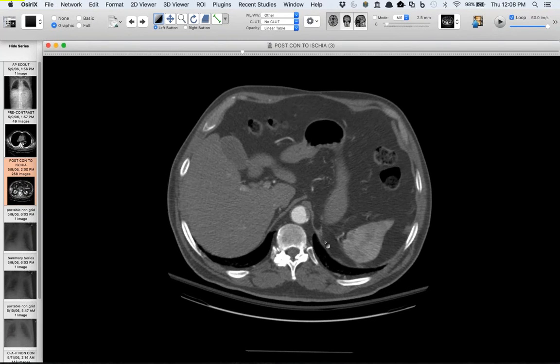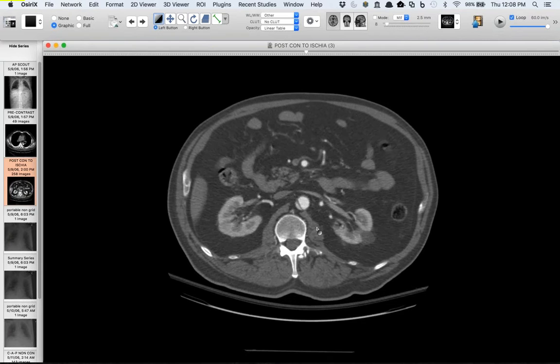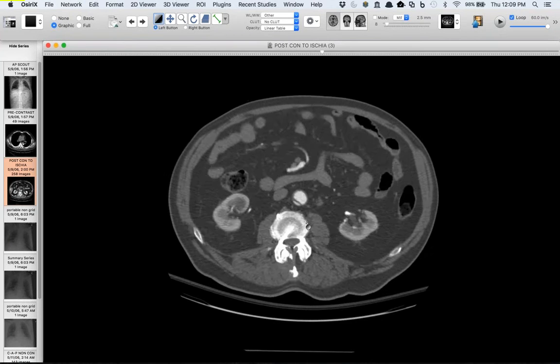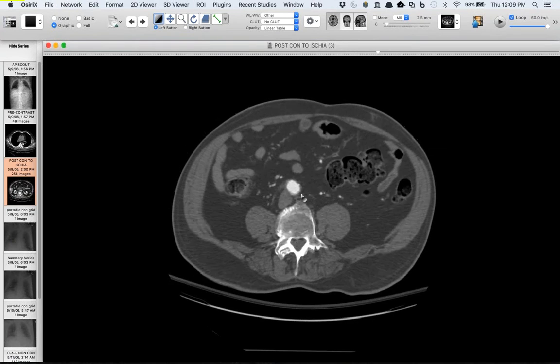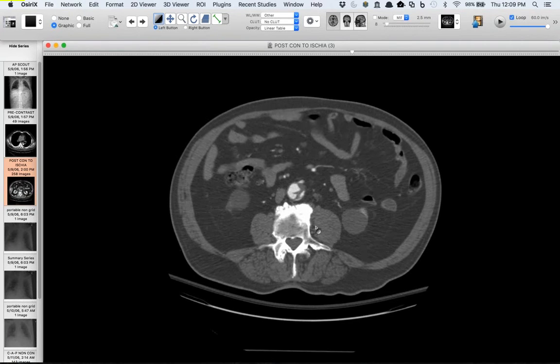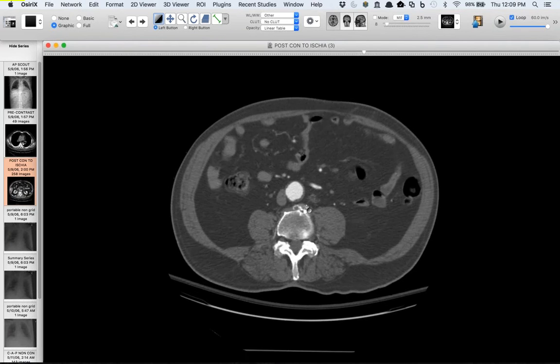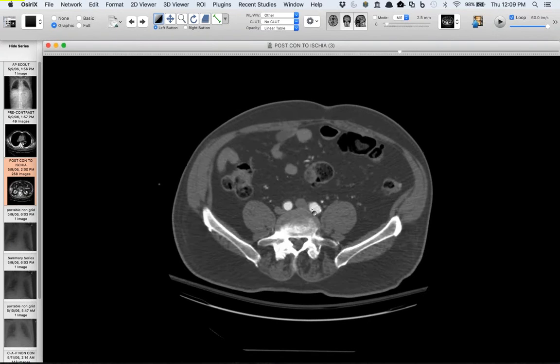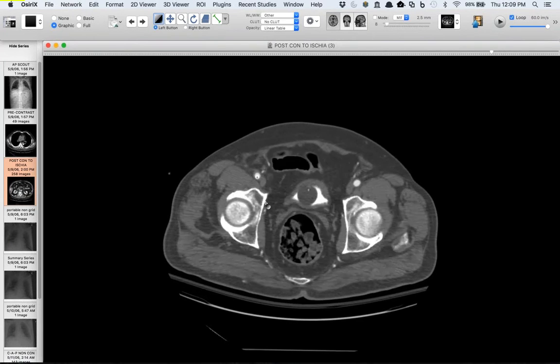And I'll show you the rest of his aorta here. Now in the infrarenal aorta, you can actually see a frank dissection flap, and it kind of communicates within the distal infrarenal aorta, where he looks like he has more of a diseased aorta. I don't know how much of this is pre-existing within this abdominal aortic aneurysm, or how much of it is inflicted, but you can see he's got atherosclerotic disease lower down. And also notice how tortuous his vessels are. So here you can see is the femoral sheath.